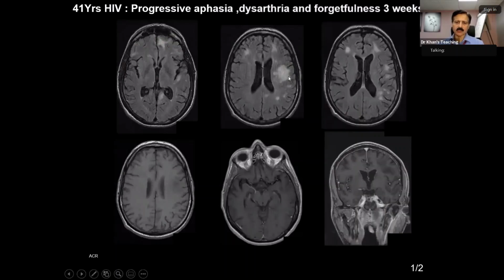It is one of the pathognomonic signs of PML, and it will not enhance. Please remember, in the viva, they will show you and you will ask, I want to do enhancement. Because if it enhances, your differential changes, goes into lymphoma, toxoplasmosis and TB, etc.